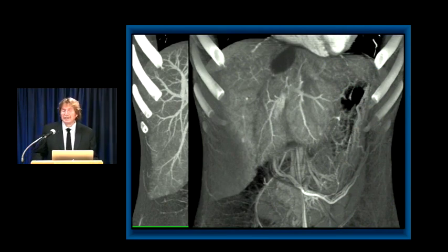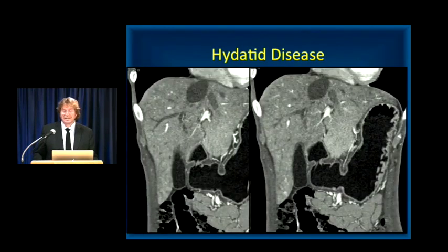This was biopsied. It was the only thing we found in the patient, and it ended up being Hydatid disease. The patient had been to Mexico for a week at spring break, and somehow or other ended up with Hydatid disease, even though the patient was native from Baltimore. So even when you're not thinking about fungal disease or Hydatid disease, or something we typically say is for foreigners, well, if you travel to foreign countries, you may be the person with that disease.